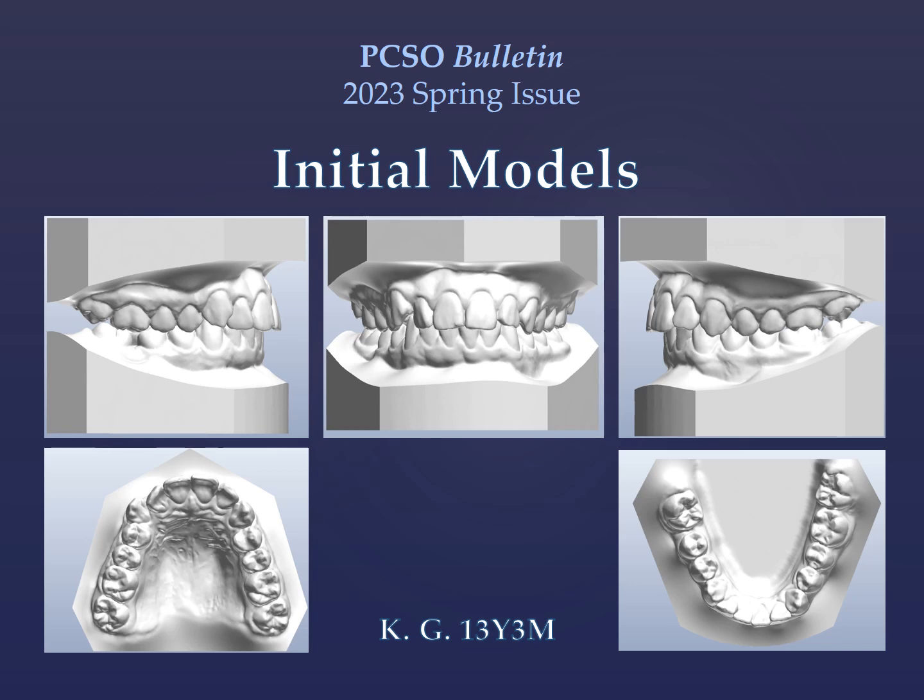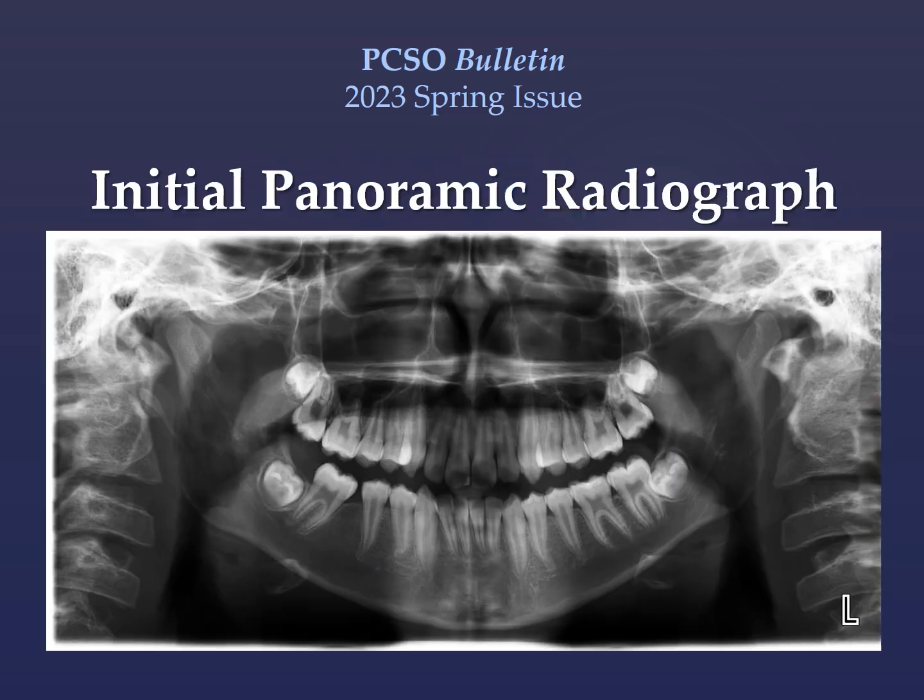The lower right 7 had favorable eruption into the place of the right mandibular first molar, or the lower right 6. However, it is still significantly tipped mesially, as evident also in the panoramic radiograph. The pre-treatment radiograph shows normal condyles of good cortication, and besides number 30, he has a full complement of permanent dentition, including developing third molars in all 4 quadrants.